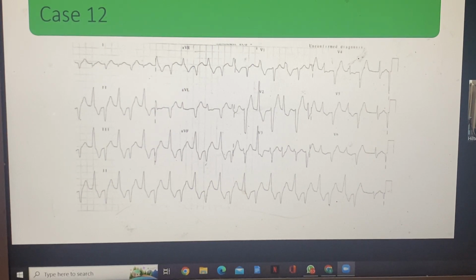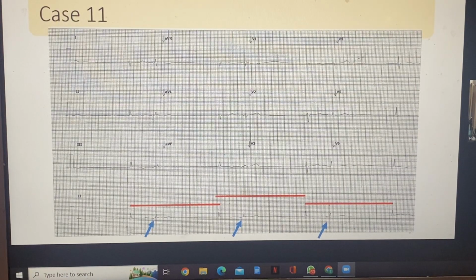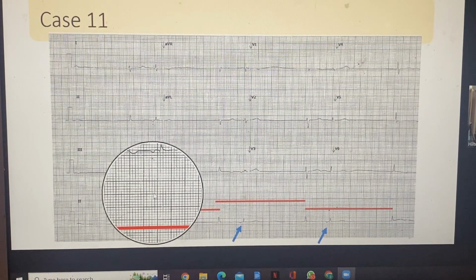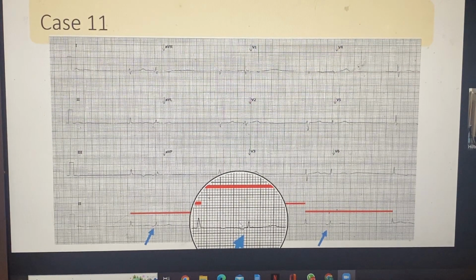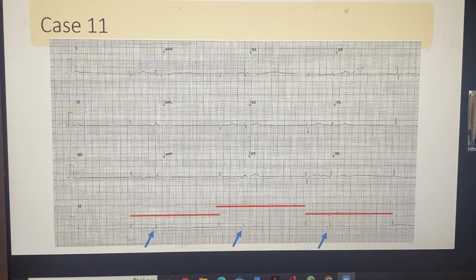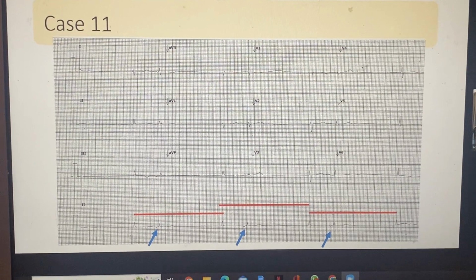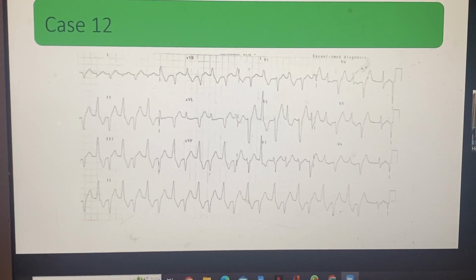Just now, your question was whether it's possible to be an echo. Look at the second bit. I think maybe you're thinking that because of the PAC, after the QRS there's one bump there. But if you look at the subsequent one, there is no bump. The second arrow is pointing to the QRS, which is quite clean. So I think maybe, for the first one, yes. But subsequently, you say in EP anything is possible, it's still possible, but a bit unlikely. So going back to case 12, can we just have a look at the answer?